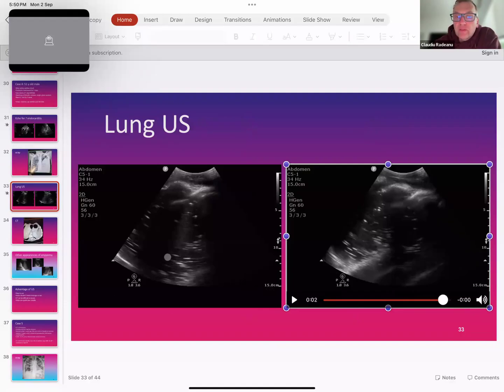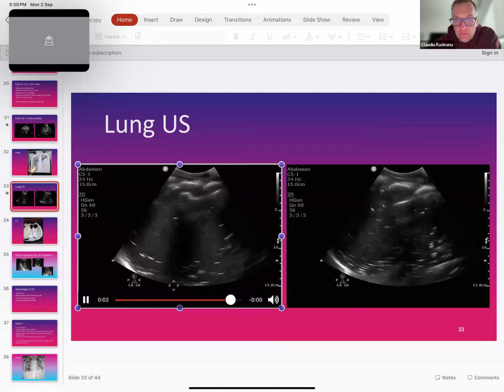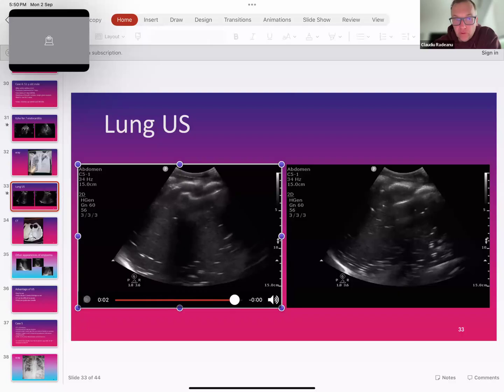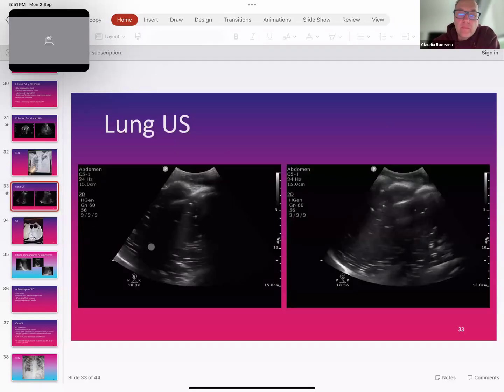So you have the fluid inside. It has more consistency, probably that is the word. The white part in it is some bubbles of air inside. I'll show you the image of the CT. The CT looks like this. This is the lung, and this is part of the kidney, but the lung was pushed and collapsed. So this is the empyema here. It's a big collection, and you have air in it because bacteria produce air as well. So this is a typical appearance of an empyema.